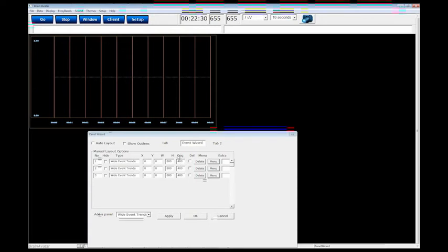Now, the thing that is confusing right now is this OPQ is to be over here, and it's just because the software itself is not used to my alignment. But the 4 boxes and all that, that's basically saying my width and my height. So yes, I do mean to type it in there. Yes, I do mean that they are opaque and you can see through them.